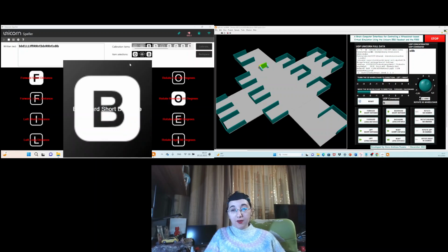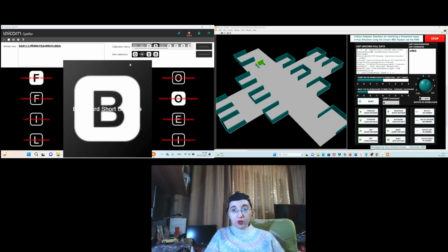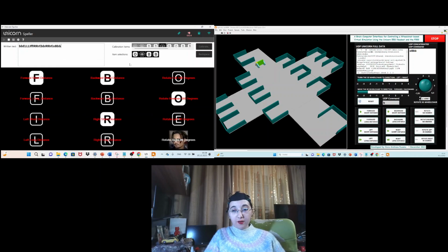Perfect. Again, the same command. Backward short distance. Everything worked perfect. 4 commands correctly achieved.